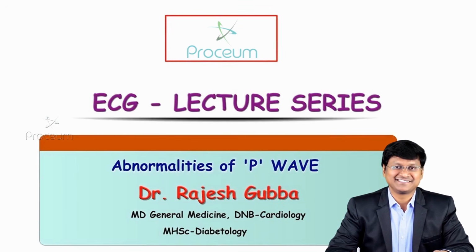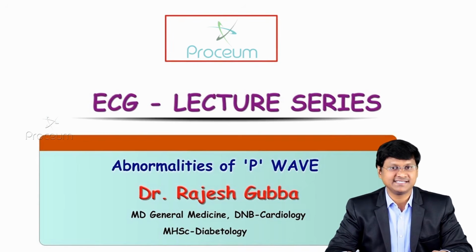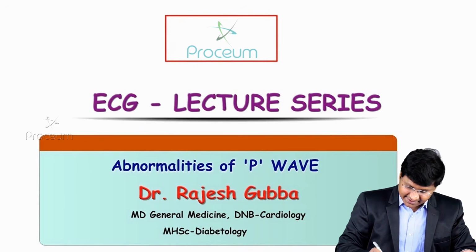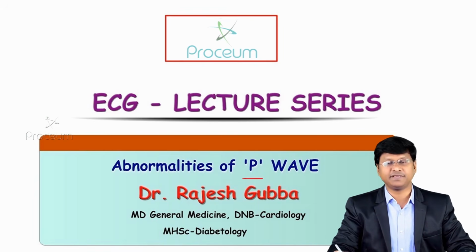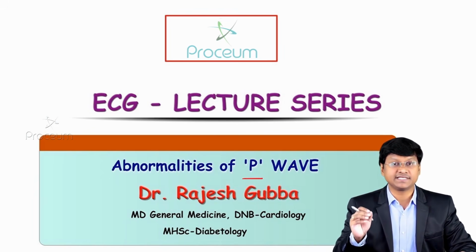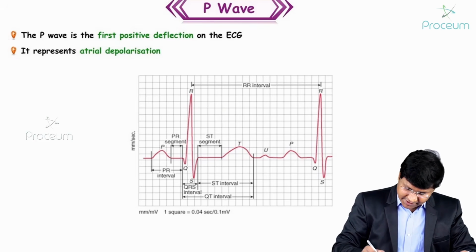Hello my dear students. As a part of the continuation of this ECG lecture series, in this session I will be discussing the abnormalities of the P wave. So if you take the P wave, it is the first positive deflection on the ECG, right? Let me just show you that. This is the first positive deflection within the ECG.